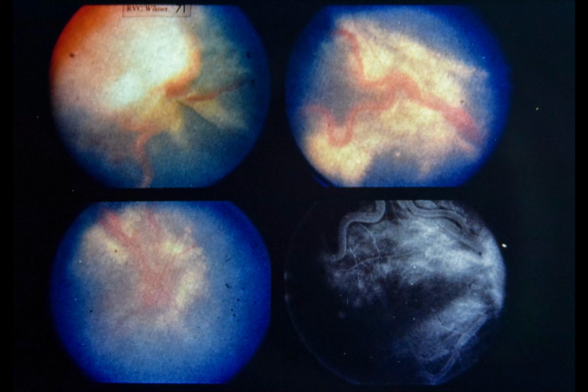Slide 71. Multiple angiomas with exudative retinal detachment. This 21-year-old black female had poor vision in the right eye since childhood. Right eye vision was hand motion and left eye vision was 20/16. The right eye had multiple angiomas scattered throughout the fundus, predominantly in the supratemporal and supranasal quadrants. Upper left, note large angioma in far supratemporal periphery. This was associated with an exudative retinal detachment.